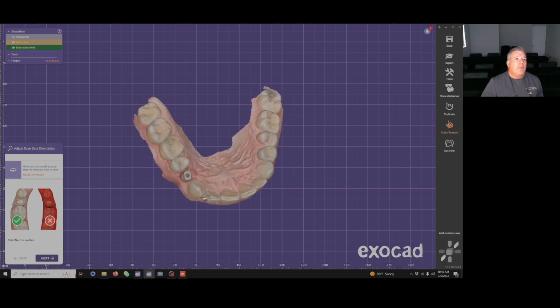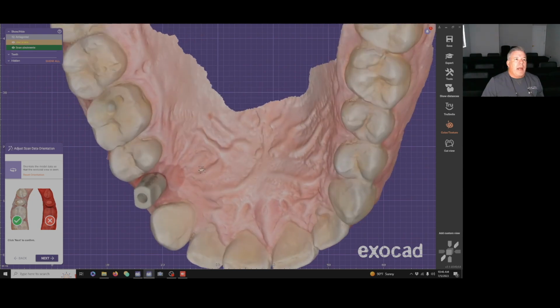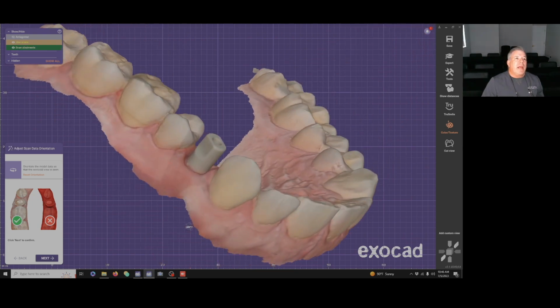And that's a different scan body you'll see. The scan bodies are specific for how you're going to make your abutment. If you're going to mill it out of a preform, say a Desk preform or an NT Trading preform, then you need the Desk scan body or the NT Trading scan body. You need to have the scan body match whichever way you're going to manufacture it. This is a true abutment scan body because I'm going to have them mill this abutment for me. And so I have to use their scan body for it.